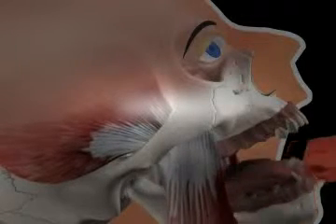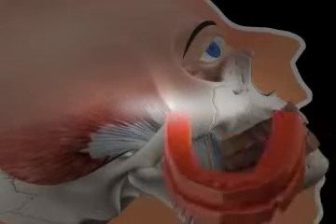The dental technician is now able to position the plaster models in a definite relationship to each other. Now the prosthesis can be produced in the articulator. In most cases, a so-called wax setup is created, meaning that the teeth in the prosthesis are not yet mounted in plastic, but rather in wax.